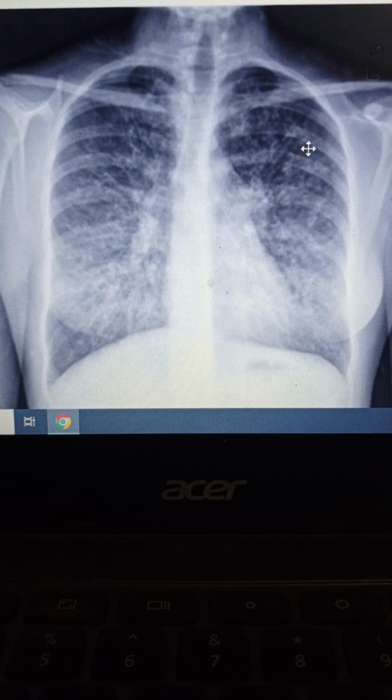After we performed the chest X-ray and correlated it with his clinical findings, we made a diagnosis. Can you guess the diagnosis now? I have given you the symptoms of that patient, so it can be easy. With correlation with the clinical findings, you can diagnose that this patient has bronchiectasis.